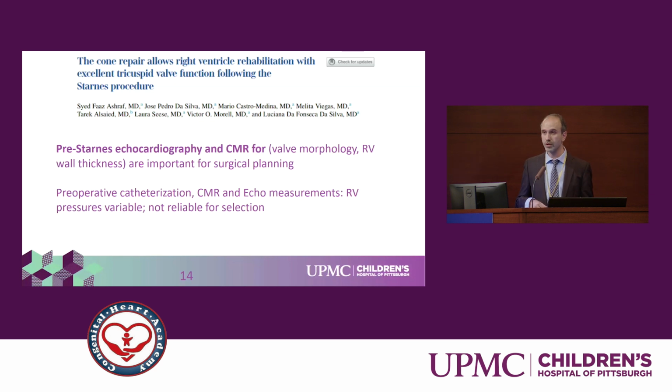Cardiac MRI can be really important in these patients, and it allows us to evaluate the valve morphology and the RV wall thickness, and these are important factors for the surgical planning. However, the preoperative cath, CMR, and echo measurements of the RV pressure were very variable, and they were not reliable for selection. Similarly, the RV function or wall motion tends to be severely depressed post-Starnes, but gets a lot better after the cone operation.